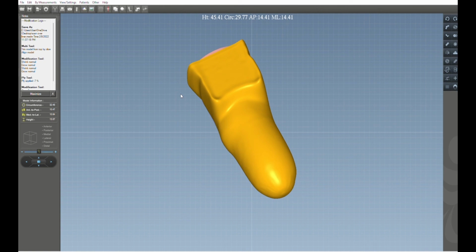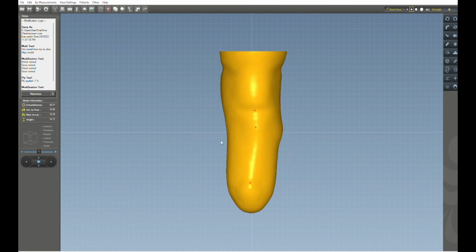And maybe you want to just take off this little edge that we see here. It's a little too sharp there. So to do that, I'm going to just use fill. I'm going to fill it in a bit there. Just to take that away, a little blending. Just smooth that little gap, because I don't want it to be a sharp edge from the modification. Everything else is looking quite nice. Let's have a look at it. Okay, maybe a once-over cleanup. Good job. And that's the end of the blending.